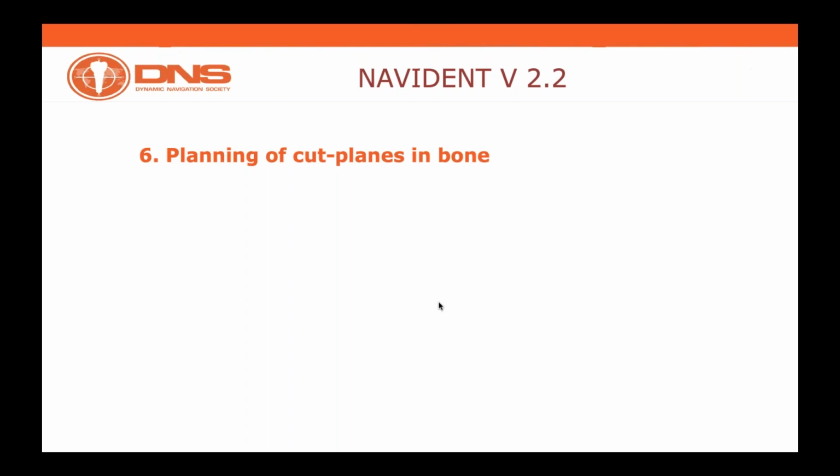Number 6 is to add saw cutting planes, and we will see how we can achieve that, and also the important clinical applications available now by introducing a cutting plane.